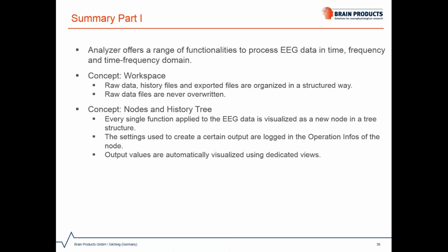We learned about the concepts of nodes and the history tree in Analyzer. Every single function applied to the EEG data is represented as a new node in a tree structure. The settings used to create a certain output are logged in the operation infos of the node. This and many other functionalities can be accessed via right-clicking.